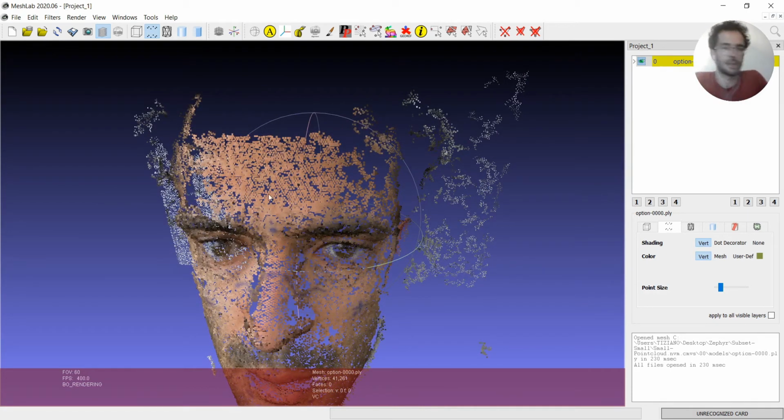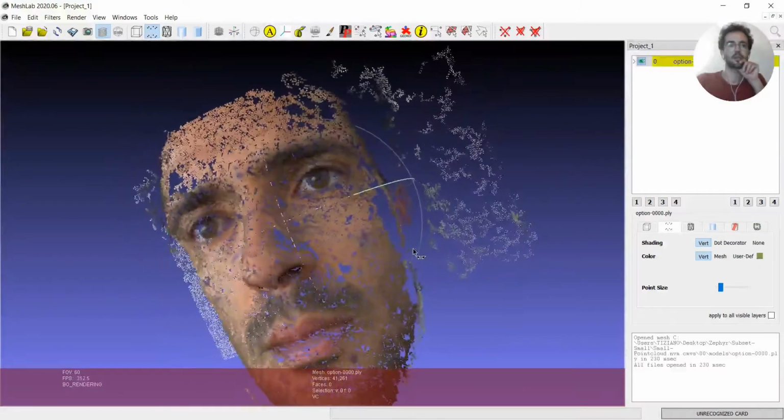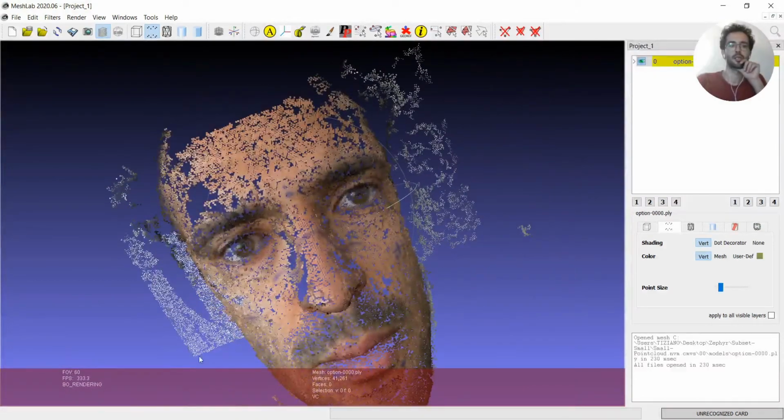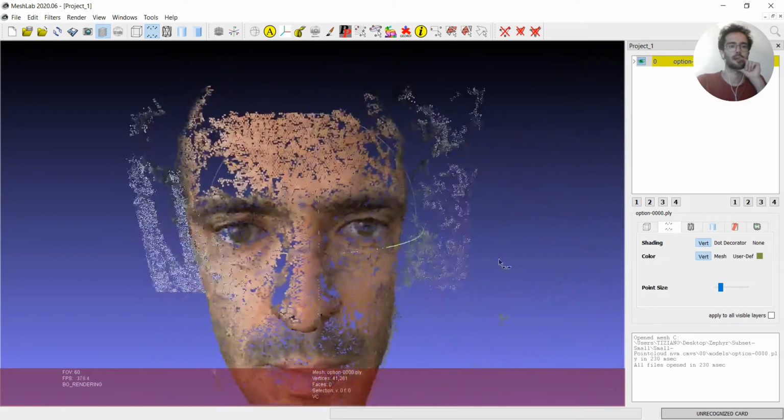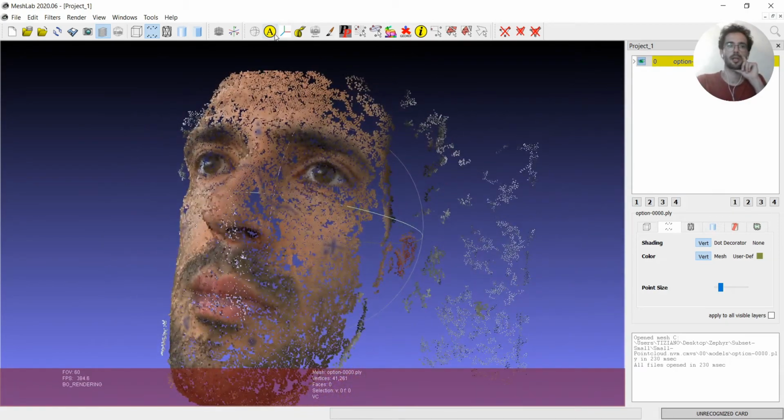So it's kind of a bit different, but all the other 3D scanners start from a point cloud, actually. So we're gonna transform this into a 3D model, and we're gonna scale it up until it's on the right measure. Okay, so we can start from the scaling, which is the easier part.